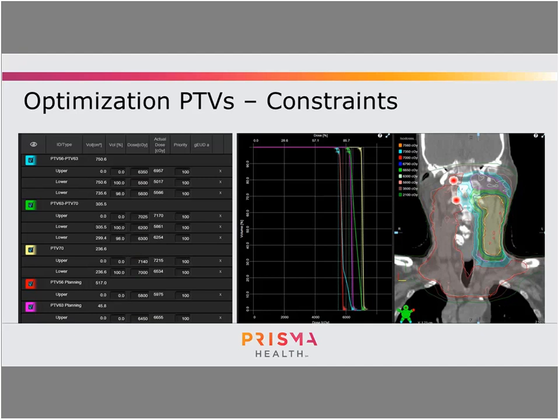So what that does is when you're looking just at this structure, if you were to take a line and go through this profile here on the PTV 56, you'd have a very homogeneous dose distribution in here. You wouldn't find like a 60 gray or so floating down here in the bottom, which, if you did a 1 or 2 millimeter PTV expansion, you don't have a good method to eliminate that dose unless you go in and you're actually contouring out voxels and saying don't put dose there. So in terms of making a quick plan, those PTVs work pretty well.